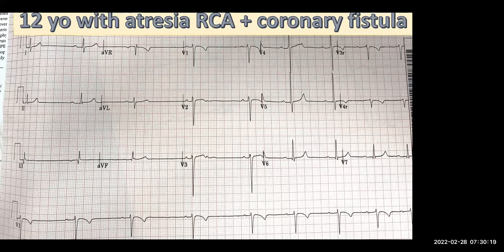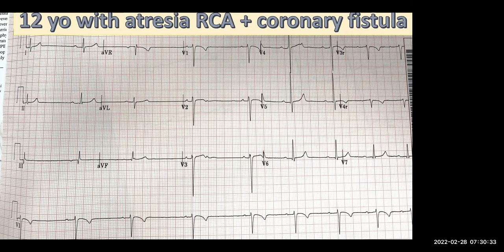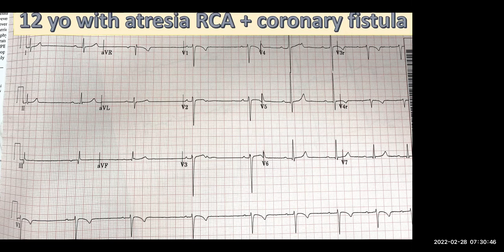I see that we become quite bradycardic. If I had to calculate a rate, it's definitely less than 60, almost like 40s. I'd have to do 60,000 divided by the cycle length to get the heart rate, which is in the low 50s, but okay. It is sinus rhythm, and the axis looks normal, and the T waves look actually fine.